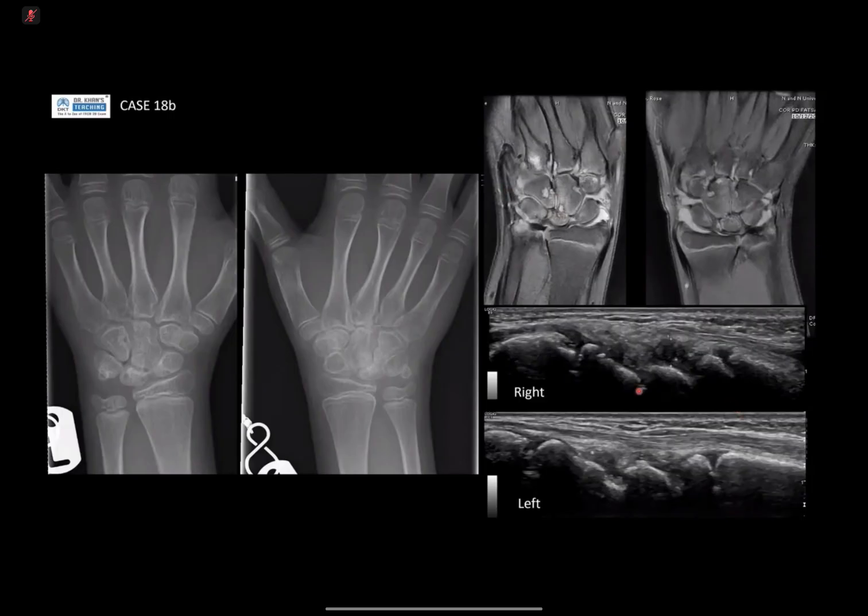Now, on ultrasound, this is your classic view of your wrist joint, the radiocarpal joint in the midline of your wrist, and the black bit shows synovial thickening. The only bit that I didn't give you was the Doppler, which would show vascularity, suggesting it's active synovitis. So in arthritis in a child, if you just had treatment, you can have a lack of Doppler vascularity, but you still have synovial thickening persisting for a bit until the treatment starts to kick in. But you can notice that the right side is a lot worse than the left, which corresponds with the patient's symptoms.